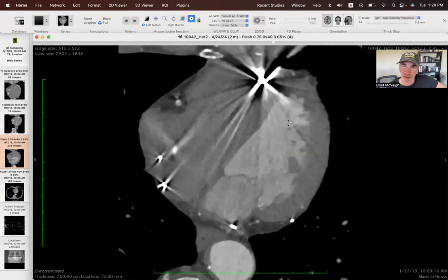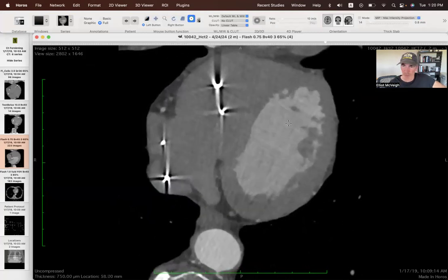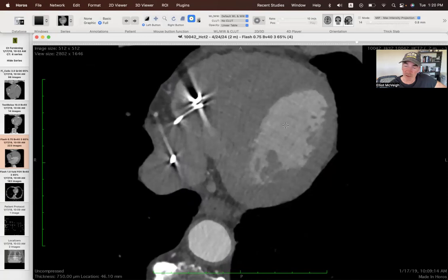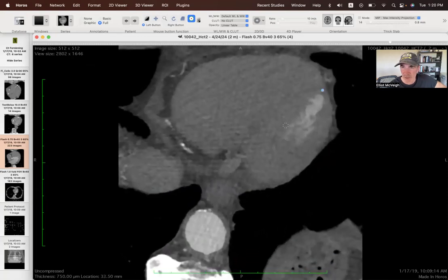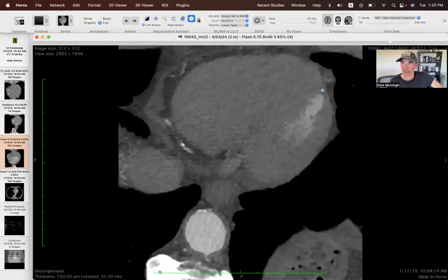So now we're going to go down and find the apex, where that is. And I'm either using a roller on the mouse, or I'm using 2 fingers to drag down, and I go down through slices, or I can use the left arrow, right arrow. And that becomes helpful sometimes, the arrows, when you want to move just a single slice. So 1, 2 arrow hits, and now I've got this one.